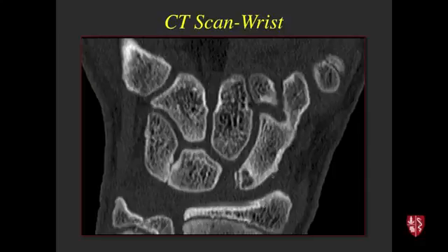The abnormality in this example is, this is the scaphoid region here. This would be the lunate and the triquetrum. This space is too wide, and that ligament's probably disrupted there. And it's partly because this patient had developmental fusion of these bones. The lunotriquetral bones are fused, and the scaphoid's fused here, like a developmental anomaly that probably put extra strain on that articulation.